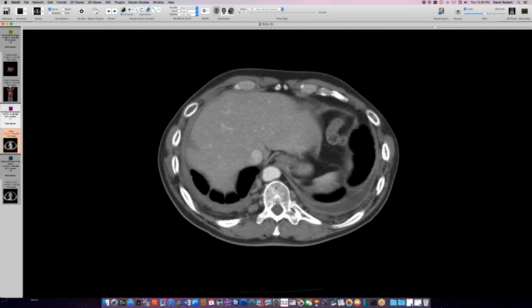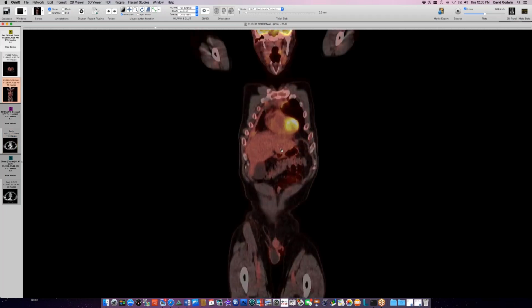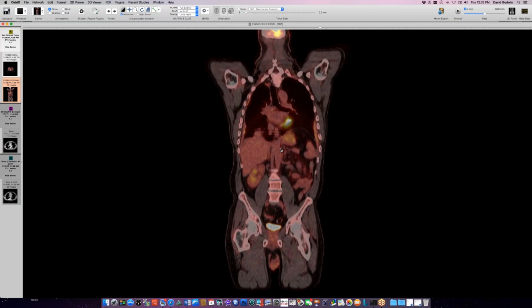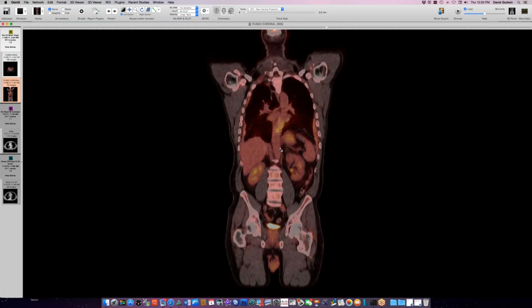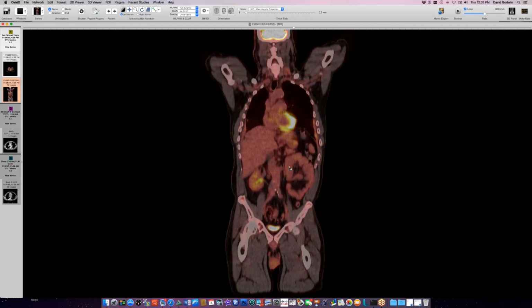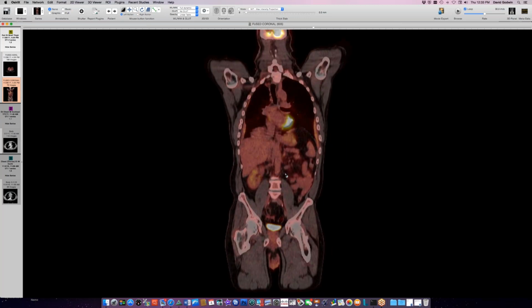We don't catch the kidneys by chance, do we, to see if there's a lot of tumor in the kidneys? We do on the PET, and they're doing okay. Okay. Wow. So no liver disease, no pancreas disease, no renal disease, no Erdheim-Chester halos around kidneys or anything like that. No retroperitoneal fibrosis squeezing ureters and things like that. But the spectrum of IgG4 disease is still in the process of being defined. So at this point, we're seeking some outside consultations, but IgG4 is the working diagnosis.